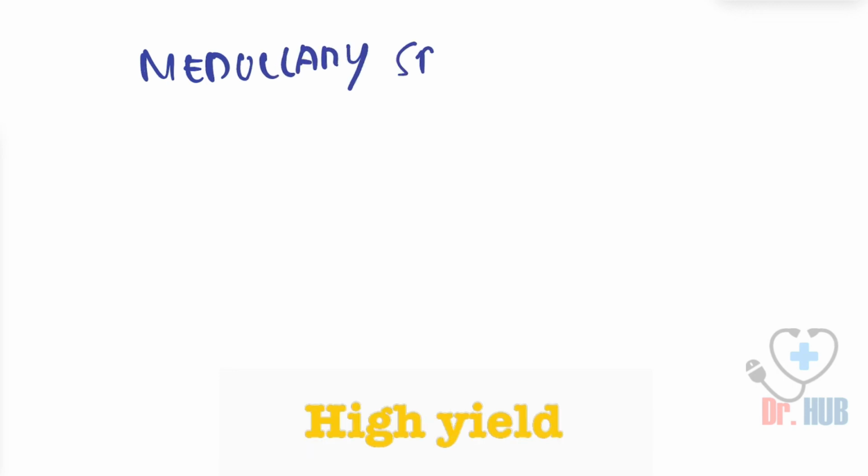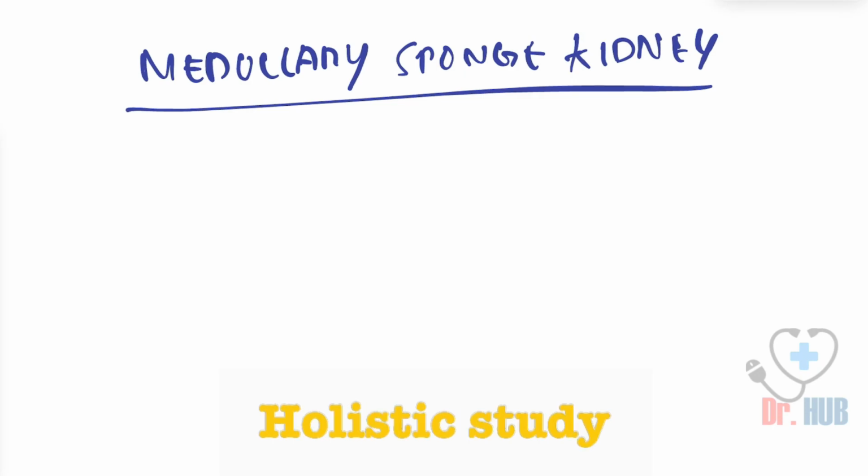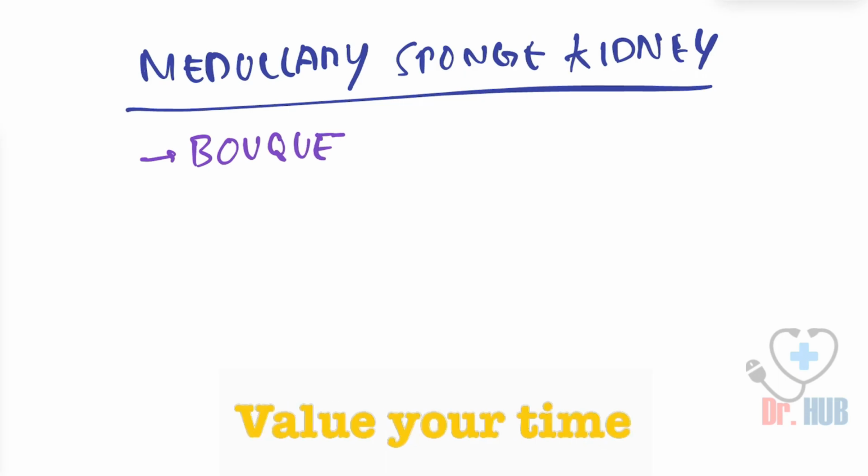First we are going to start with the medullary sponge kidney. The medullary sponge kidney has a bouquet of flowers appearance.